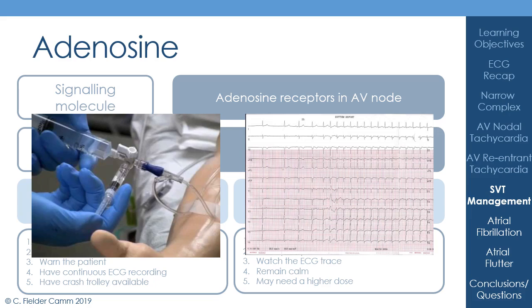And you can see on the right-hand side that this is an ECG machine set up to read continuously. So instead of having those 12 leads in those 4 columns, you've got all the leads from top to bottom running along at the same time.